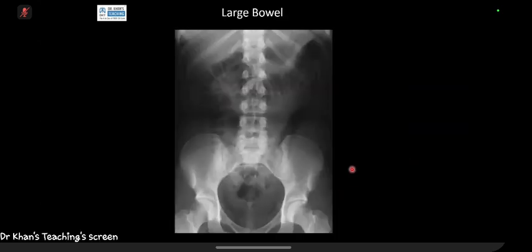It all depends on what kind of patient is scanned, and at times you have got air like this in a normal X-ray. You can see the haustra. You can see the outline. Develop your eyes on the outline of the haustra. This is a crisp and sharp outline. In an exam, a case which you will get is toxic megacolon. Favorite exam case, toxic megacolon. You will lose the outline of the haustra.